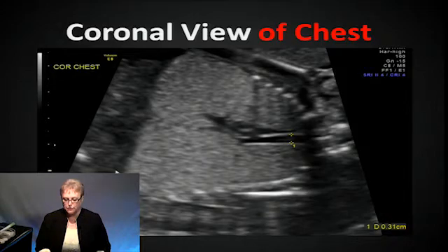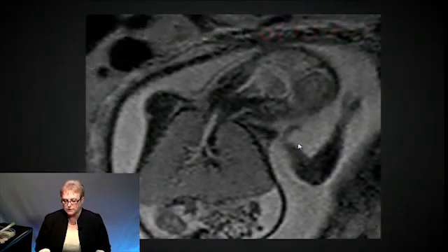What can we say about the diaphragm? Is that the normal way the diaphragm looks? No, it's inverted. So flattened or inverted diaphragm, and then looking here. That's the trachea. You should not be seeing the trachea dilated like that. This was the MRI. So you're following the trachea all the way down to the bronchi.